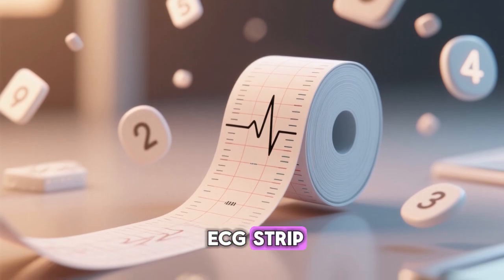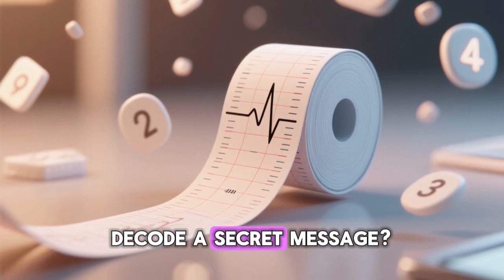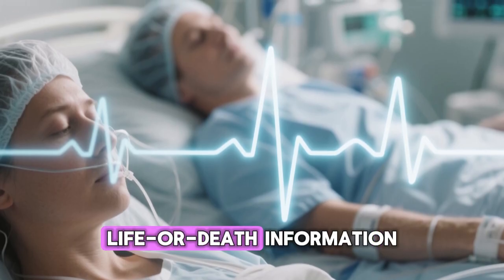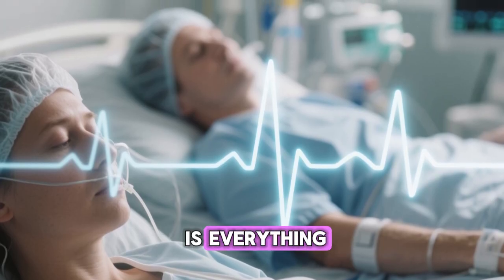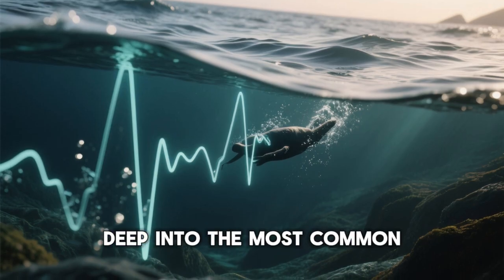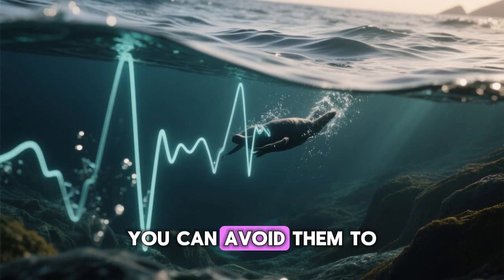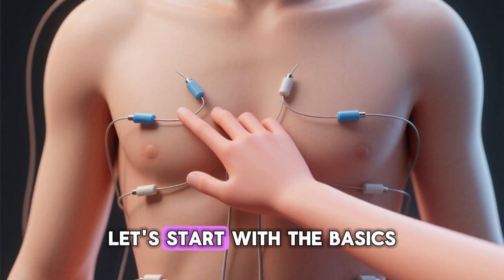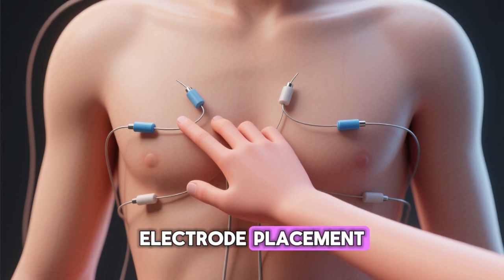Ever stared at an ECG strip feeling like you're trying to decode a secret message? That squiggly line holds life or death information, and getting it right is everything. Today, we're diving deep into the most common pitfalls in ECG analysis and how you can avoid them to become a true ECG master. Let's start with the basics: electrode placement.